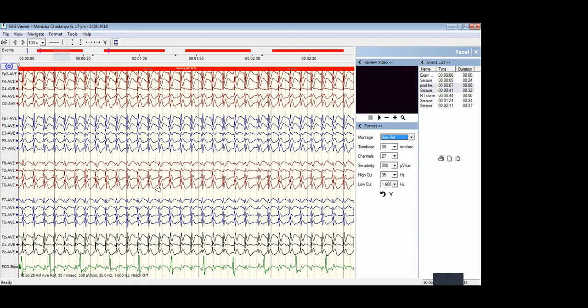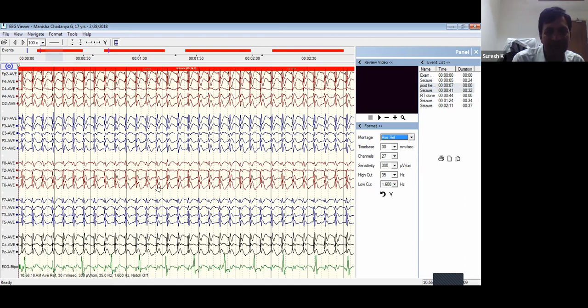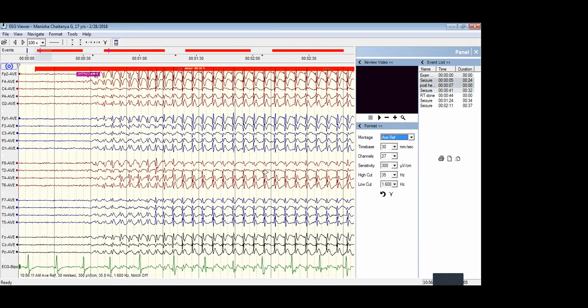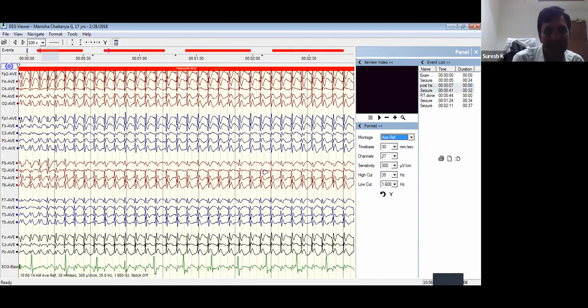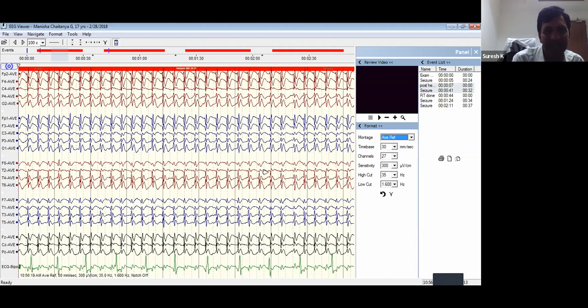So this is 10 seconds, yes? 11, 12, 13, 14, 15, 16, 17, 18, 19. So it is almost 20 seconds.